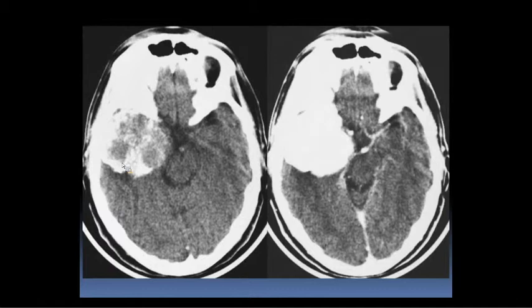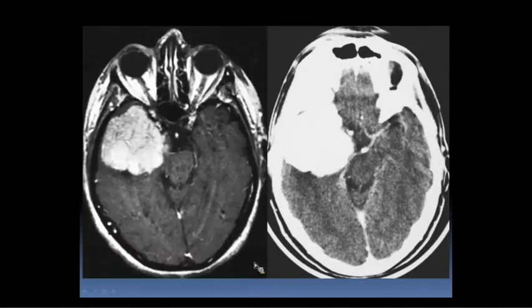So this was a meningioma, a large meningioma, and we're actually looking at the calcification within the lesion itself on non-contrast studies. The fact that it's calcified already helps us think it's a meningioma versus another dural-based tumor. And the fact that it enhances diffusely tells us for sure that it's a mass, a tumor, not a hemorrhage, even though it's looking bright on the non-con like hemorrhage might. And this is an MRI, just better showing the diffusely enhancing mass.